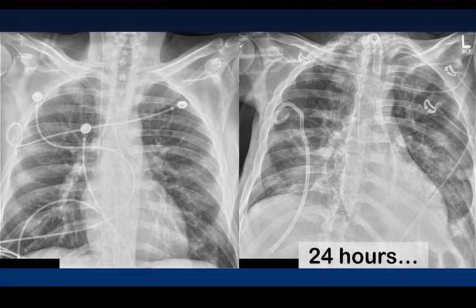Here's a series of radiographs on a patient. On the initial film, looks relatively normal. On a follow-up film 24 hours later, has a chest tube in, has been trached. There's increased opacity in both lower lobes, but particularly on the left. But what I want to point out is the presence of a triangle sign, in this case pointing toward the left.